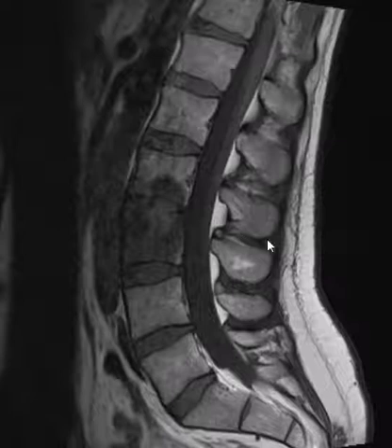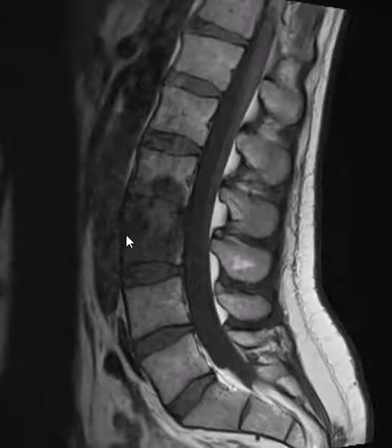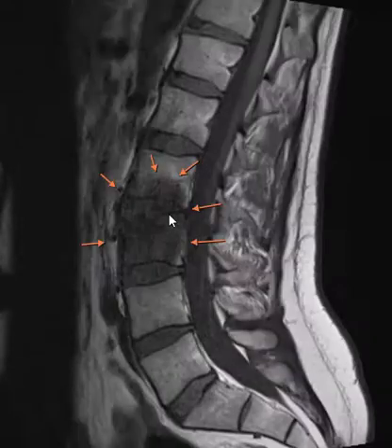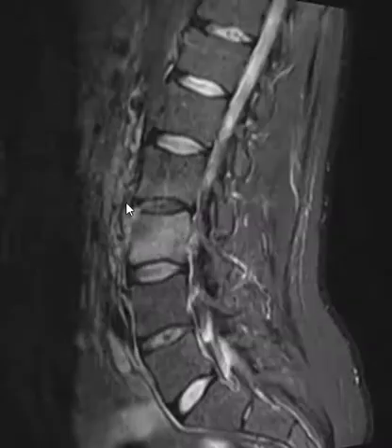This is a patient we've seen over the past few months, one of three patients who are middle-aged males. They come in with back pain or neck pain, and in this patient we saw this big area of low signal in the T1 sequence in the L3 vertebral body, also the L2 vertebral body, so it looks like probably a discitis with osteomyelitis. And if we put up the sagittal stir sequence, we see that there is some abnormality.